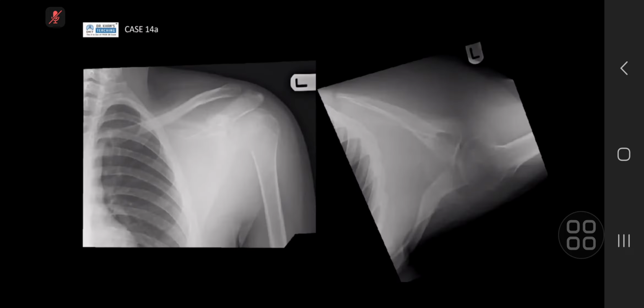Candidate 2. Given the frontal and another projection of the left shoulder joint, I can see the distal end of clavicle and humeral head. It's probably the axillary projection.